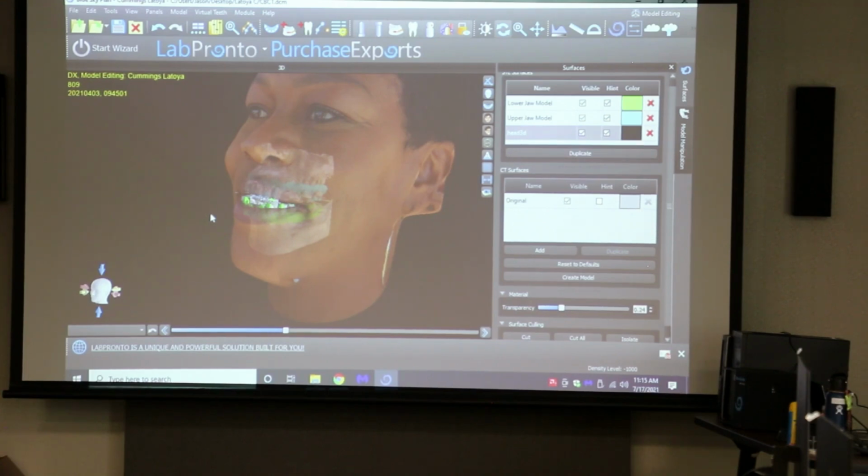That's your face scan. We want to manipulate the model. Okay. Now, in order to manipulate it, we usually have to turn from a profile, right? Drag her face forward and just try to fit it into the skin. So if you do manual alignment, does that make sense? That skin from the CT is helping you see where her face needs to be in 3D.